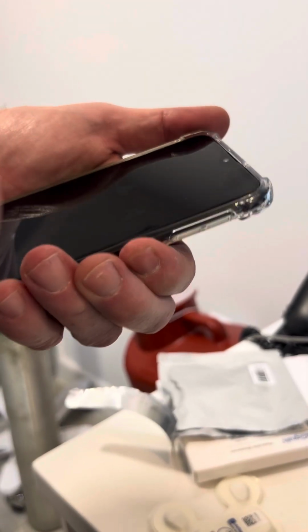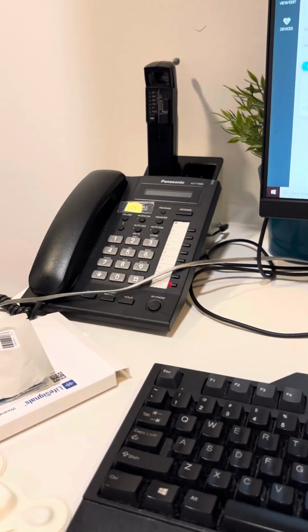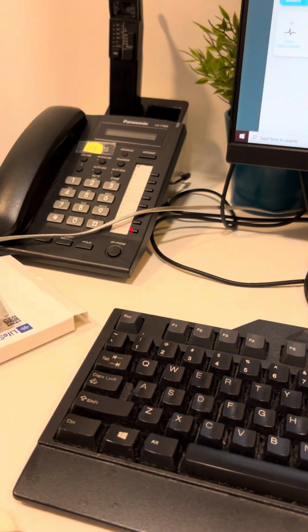Come on, why is it going dark so quick? I don't like this one. Let me see. No, it's all right. It seems like it was going dark quick. Give it a second. That's why I like to turn it on first, though, so you don't have to sit here and wait for this.